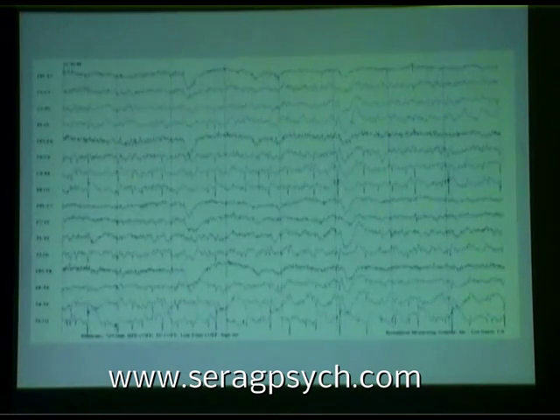Next, please. And these are old slides from biomedical systems way back when we had it, and all our slides looked like this years ago. But this is just another example of very, very prominent occipital. But I wanted to point out in that previous how commonly occipital seizures spread to the temporal lobe.